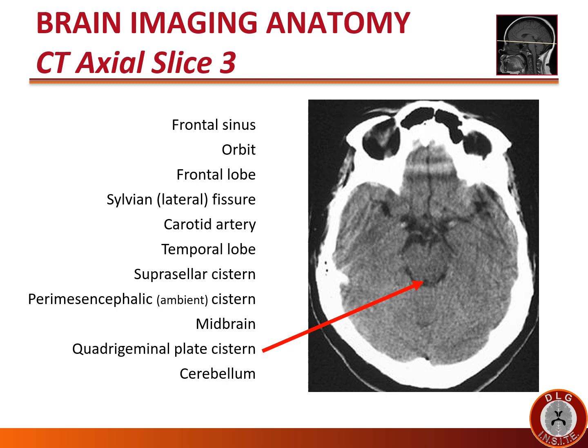The twins area, the quadrigeminal plate, is also known as the tectum. The tectum means roof, and it's called that because it roofs the sylvian aqueduct, which lies just beneath those colliculi, just beneath the quadrigeminal plate. This quadrigeminal plate cistern is commonly filled with blood during subarachnoid hemorrhages and may be obscured when there is diffuse cerebral edema.